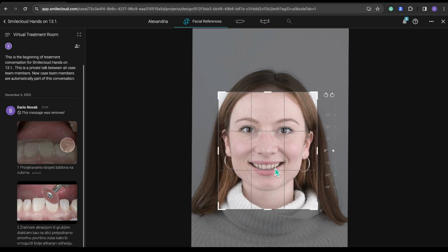a face bow, so the technician can align his models looking at this photo, so everybody's looking at this case from the same angle. So let's say we are happy with how we designed, how we placed her, and you can see here we have this first step finished.